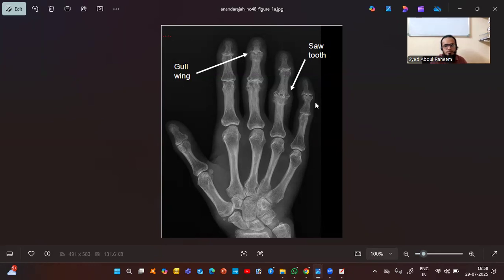and distal interphalangeal joints, all are involved. Okay, all are involved. And the sign is the eagle appearance, what we call the seagull appearance, like an eagle flying, you can see there. Okay, so this is the second thing, and all the tests are normal.